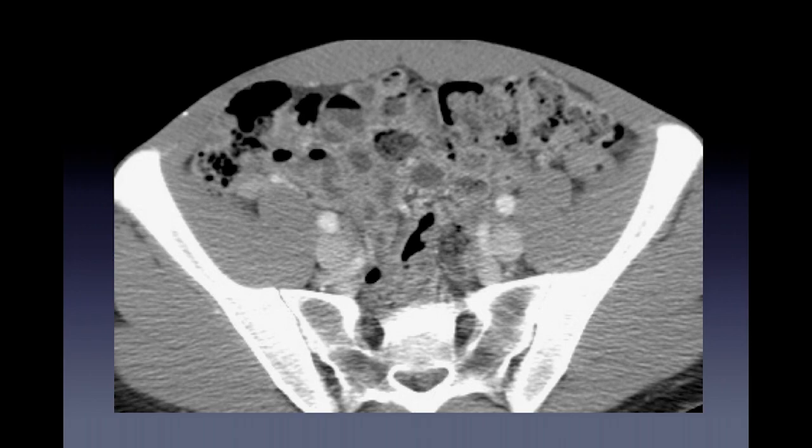So what that really means is that if you have a patient that does have a decent amount of intra-abdominal fat, if you can see fat around the cecum nicely, and you still don't see the appendix, the likelihood of appendicitis is probably something far less than that 2% statistic. So it's a very reassuring data point. Basically, if you can't find the appendix and there are no inflammatory changes in the right lower quadrant, you can really consider that a negative CT. Describe that to the surgeons. They know what that means, and move on.